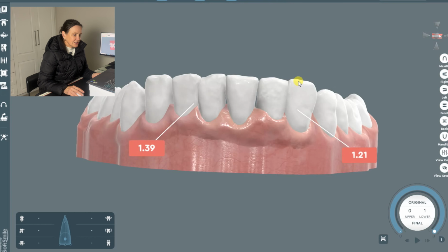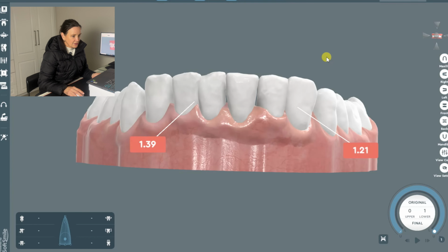What I do find is that once we start doing that, then we end up also with a Bolton discrepancy. And I need to see, can I land in a vertical dimension with my palatal cusp in a fossa or in the depth of a tooth? It doesn't help if I end up on a sliding or inclination.